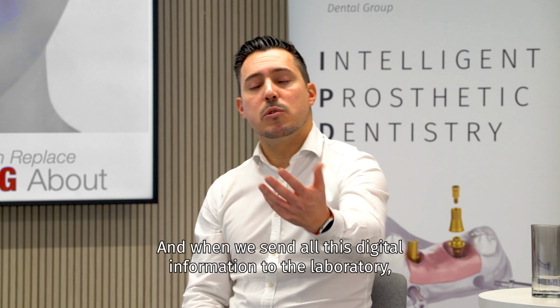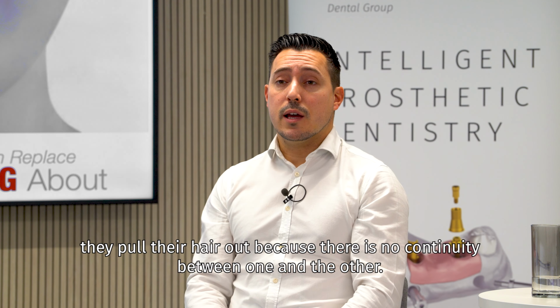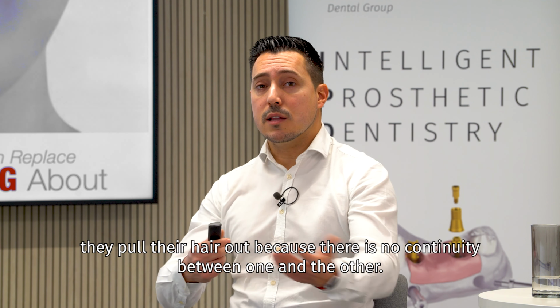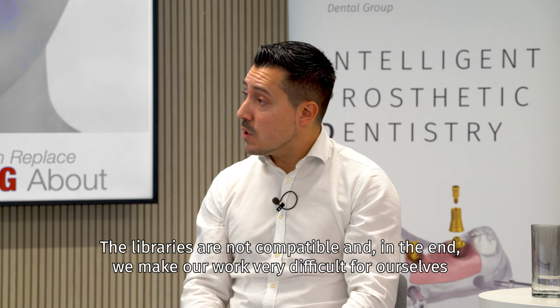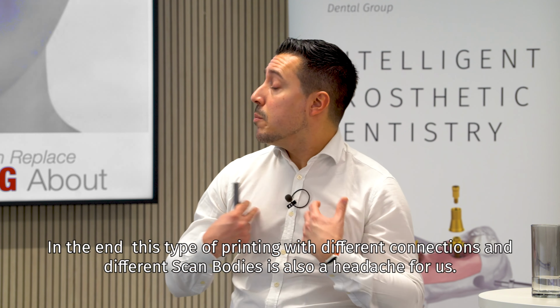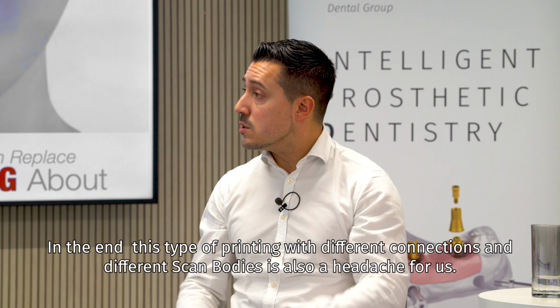And when we send all this digital information to the laboratory, they pull their hair out because there is no continuity between one and the other. The libraries are not compatible, and in the end we make our work very difficult for ourselves. In the end, this type of printing with different connections and different scan bodies is also a headache for us.